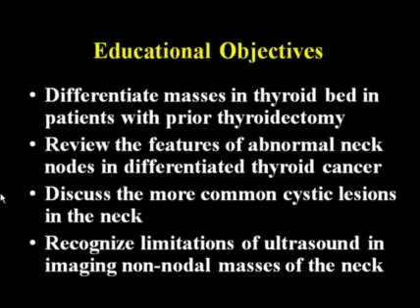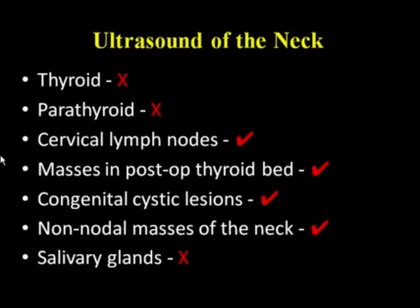I'll review some of the more common cystic lesions in the neck, and also we'll discuss some of the limitations of ultrasound in imaging non-nodal masses of the neck.